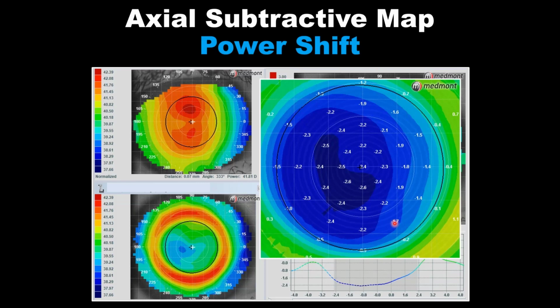growth. Now, if this were adult ortho-K, we'd be super happy with this. The blue treatment zone is extending past the pupil 360 degrees. This is an excellent outcome for an adult, or at least we would expect it to be.